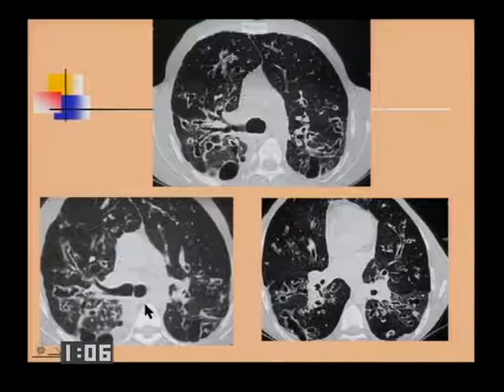We're seeing more and more children at the later end of life. There are actually now many adults walking with this disease because the treatment has become so much more effective. But they may have a markedly abnormal study such as this, showing focal areas of just mucus plugging, some bronchiectasis, and cyst formation.